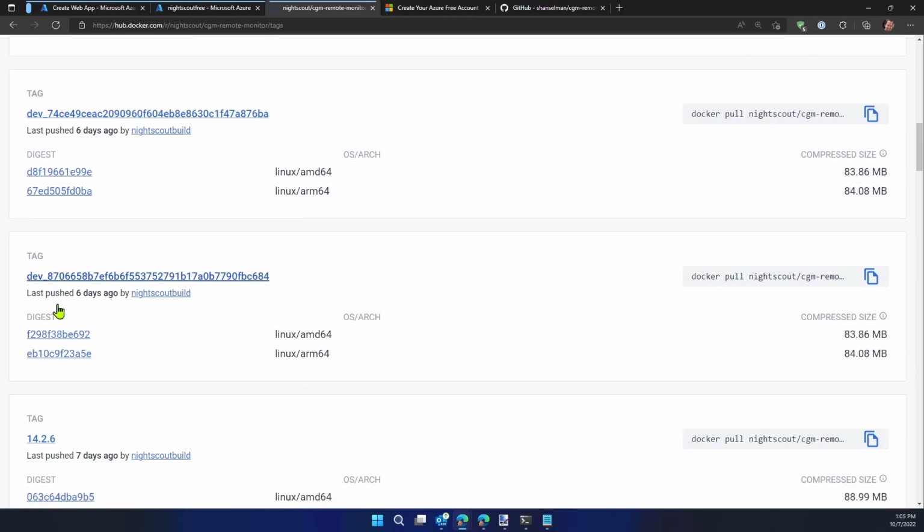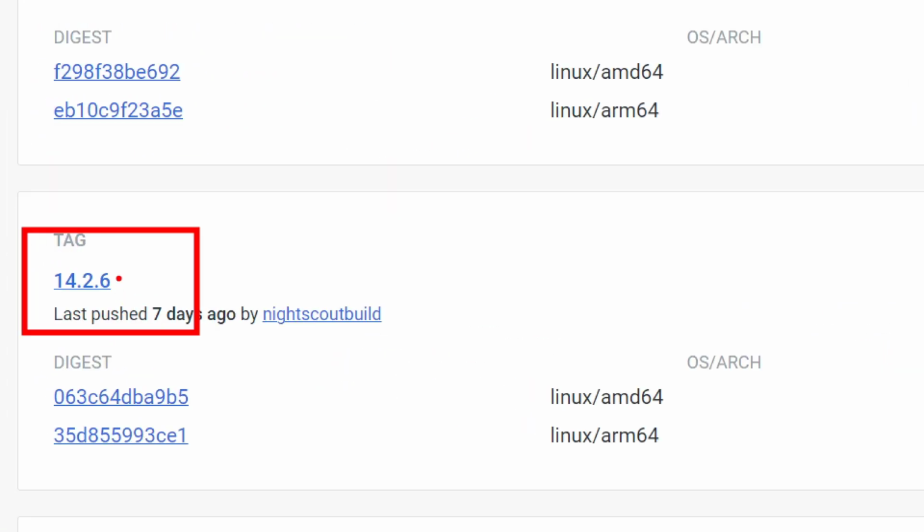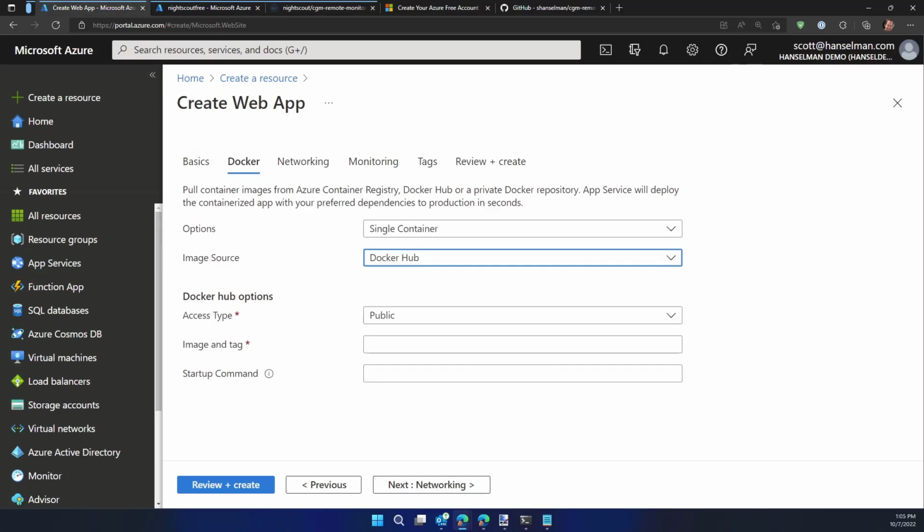I'm scrolling down, there's all kinds of stuff. Here's the latest one as of the time of this video. It actually has a specific version number. Now, if you know what Docker is, you know the difference between latest and the version, but you can go and decide what you want to do.